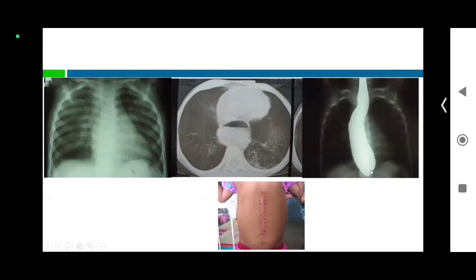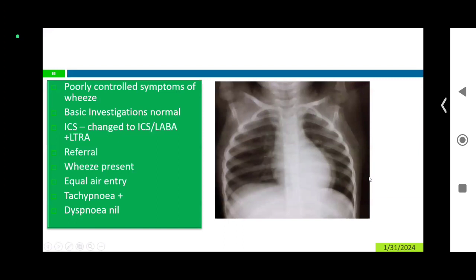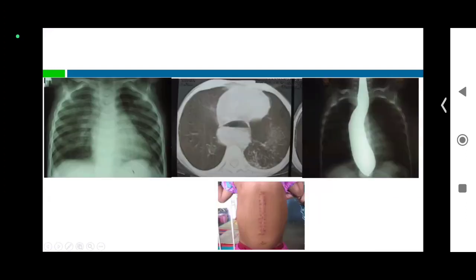Finally, we did the barium study to look at what this diagnosis is. What is the diagnosis? Achalasia. Very good. Achalasia cardia is a dilated esophagus ending in a smooth tapering end. This is nothing but your achalasia cardia. Treatment is Heller's cardiomyotomy.